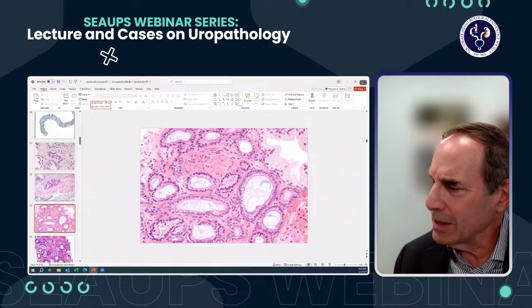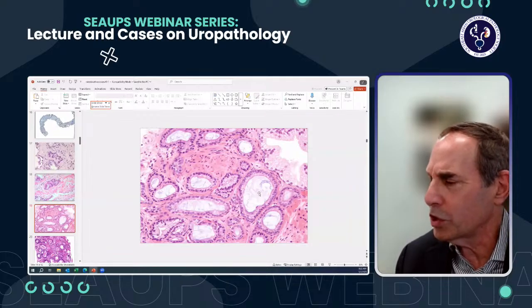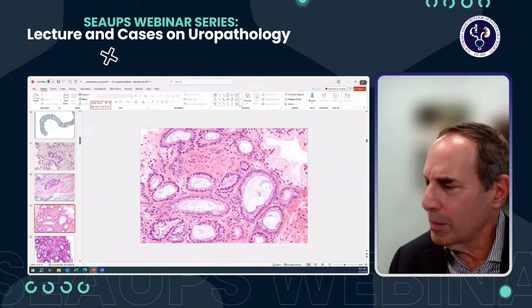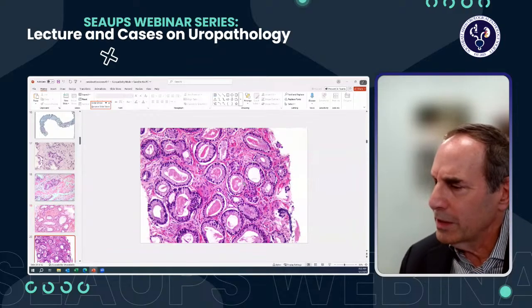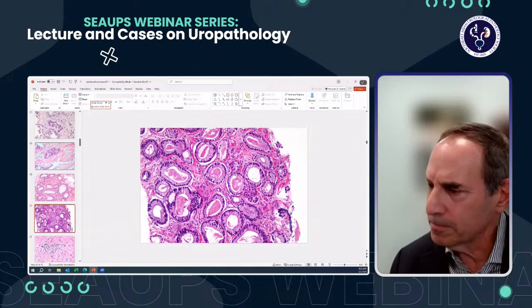When you start seeing larger cancer glands, they will often have a straight luminal border. For example, if you look at this larger benign gland in the upper right, it has these luminal undulations ruffling the cytoplasm. So this straight luminal border helps to diagnose cancer. We also see that many of these neoplastic glands have blue mucinous secretions, another feature more commonly in cancer than benign. Another feature more common in cancer than benign are these dense eosinophilic intraluminal secretions, also, again, straight luminal borders.